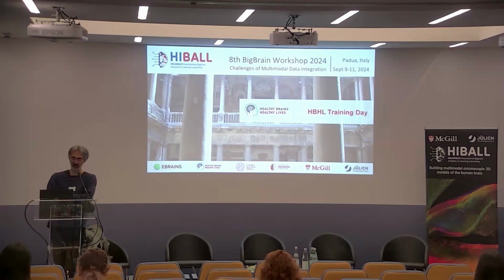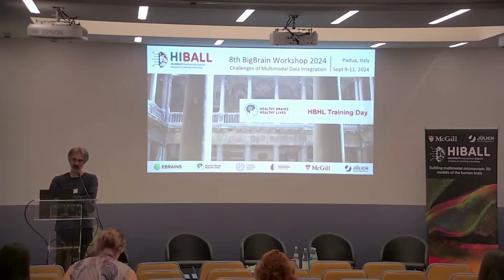We are working on this topic for more than 25 years, so we consider ourselves as kind of specialists of the sulcus anatomy, but we still make mistakes. We never have a certitude on the identification of sulci. The automatic tools also make mistakes sometimes. Not many, but it has about 90% agreement with our labelings.